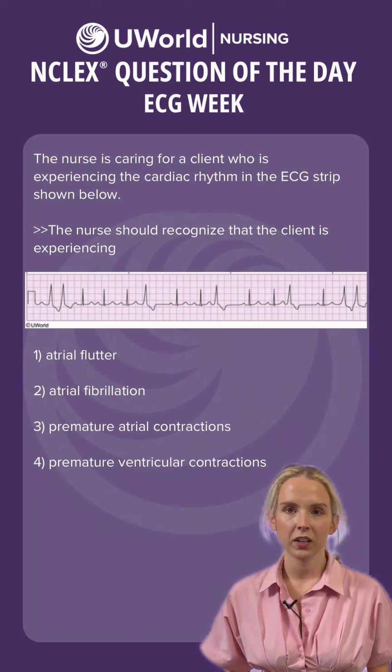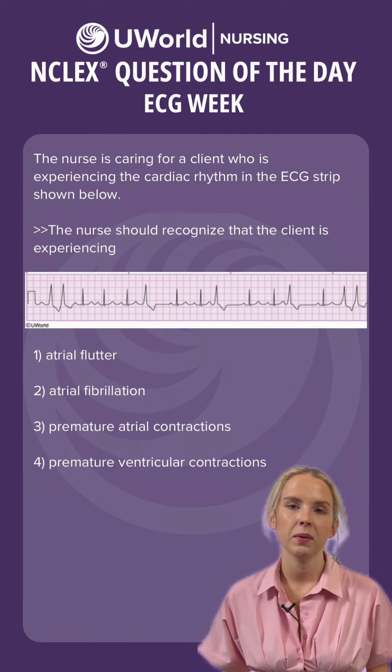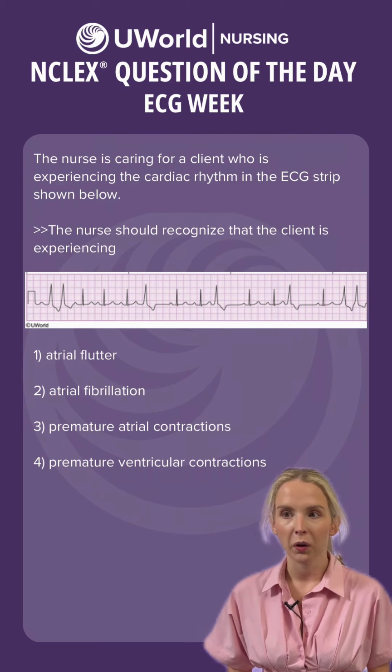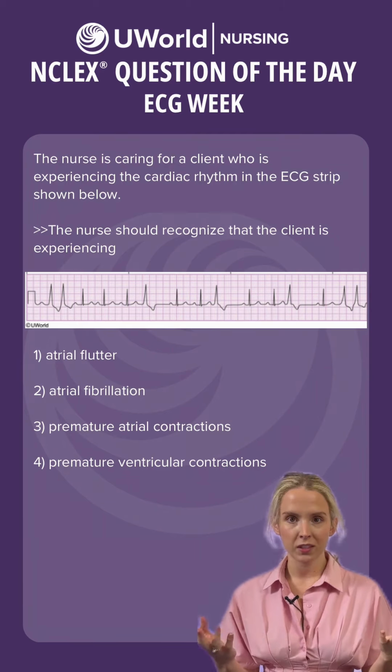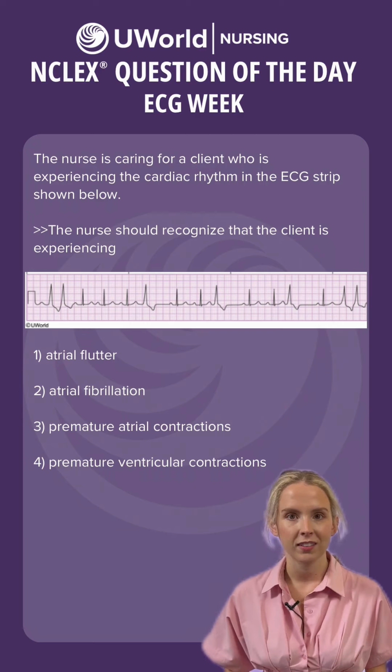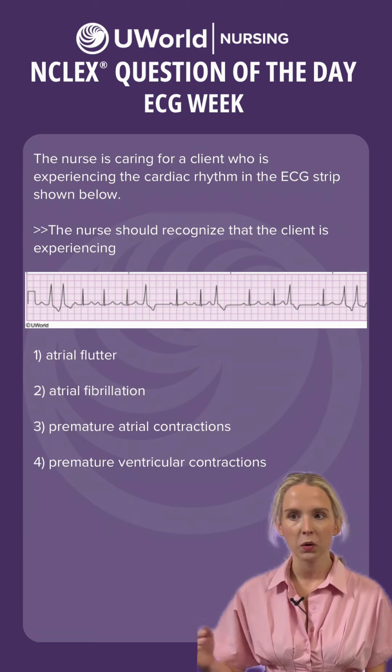So the nurse is caring for a client who is experiencing the cardiac rhythm in the ECG strip shown below. The nurse should recognize that the client is experiencing... Go ahead and read this strip. Let us know what you think. Drop your answers in the comments below. We want to hear from you guys.